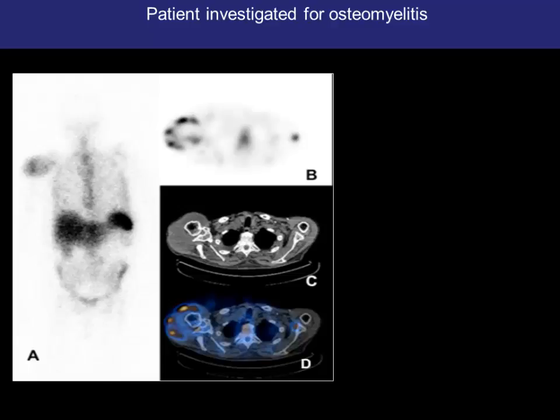Coming to this is a patient who had shoulder pain, and this is a white cell scan. And if you could see, there is increased uptake in the soft tissue in the muscle area. The clinical question was whether the patient has got septic arthritis or osteomyelitis of the shoulder. But by doing the SPECT bit, all you're seeing is the increased uptake around the periphery. By using the CT component, you can see the entire uptake is in the muscles rather than in the bone.